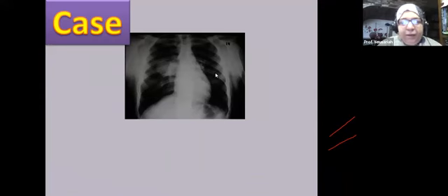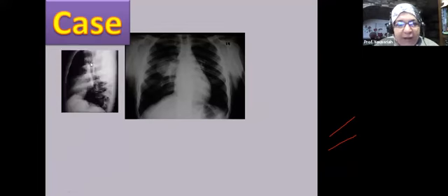In this case, this was a young male patient coming with trivial back pain. A plain X-ray was done, as you can see, and the plain X-ray showed a lesion with an overlay sign over the right hilum. It's separated from the hilum. It abuts the mediastinum, merges with the mediastinum medially, but has a sharp demarcation laterally, and it does not merge with the heart shadow. So this is a mediastinal lesion, posterior in location. The lateral film showed a vague density on the spine.